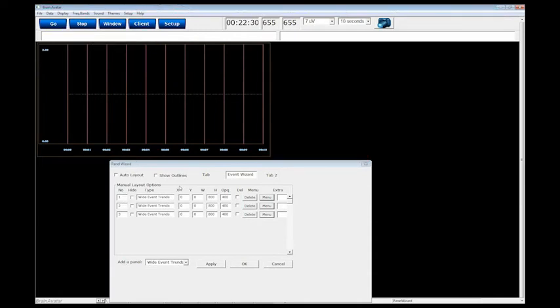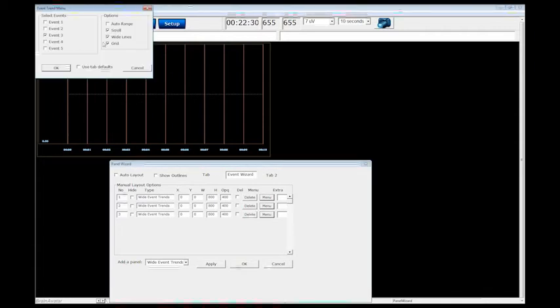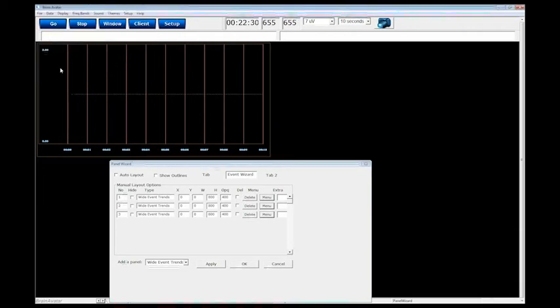Excuse me, Rob. Sorry to interrupt, Rob. Are you meaning to hit the OPQ, the opaque box there? Yeah, when you're done with a menu on what you want to do, you have to click OK to say you're OK with that. No, I mean the opaque. When you're hitting before X and Y, you're hitting H and OPQ now. Was that intended?